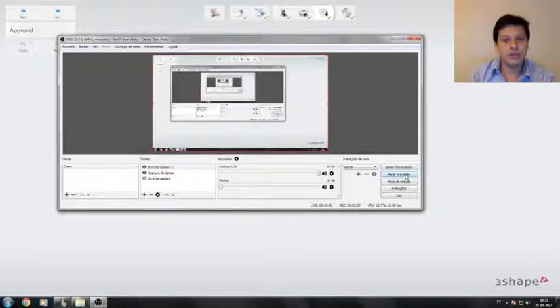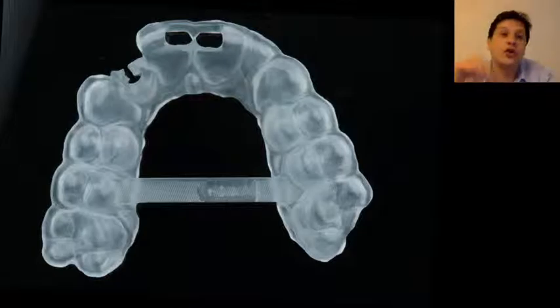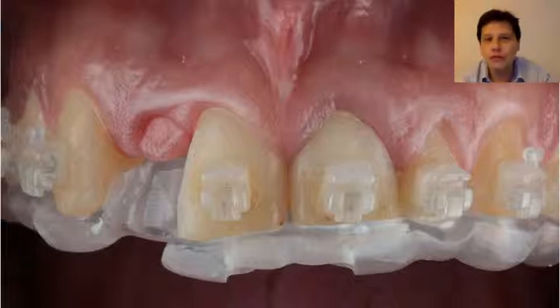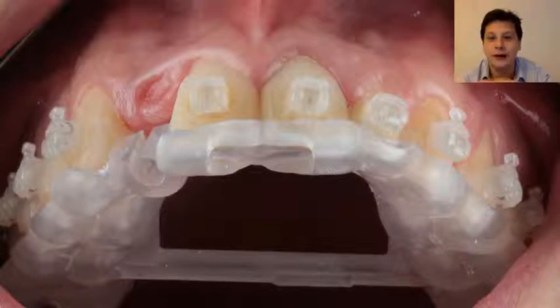Now, this is the same situation. You're going to produce a surgical guide that on the day of the surgery you're going to use to guide your implant. And then you don't have to open a big flap. You don't have to retract a lot in order to find the correct position for your implant, because that's already planned in the software since day one. The only thing you have to do is follow this guideline and see once again how digital dentistry came to help you a lot.